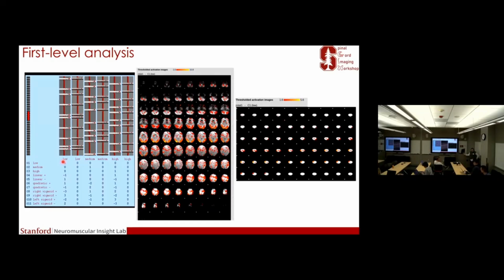Do you do denoising or anything just on the second level, or upstream? Yes, we first remove the noise and then we feed the denoised image to GLM. We use FSL for all of this, and I think we are also doing this because it allows, for example, easier functional connectivity calculations and so on, and because we are also doing it in the template space.